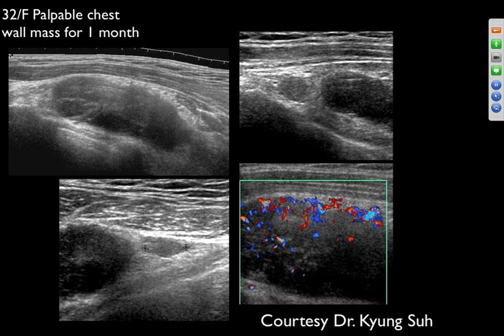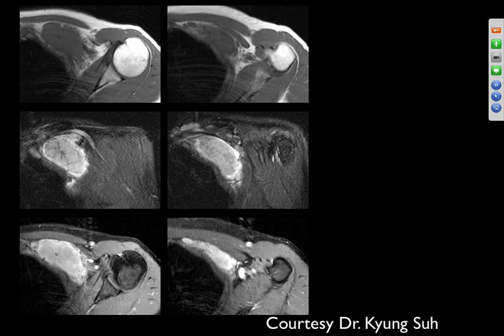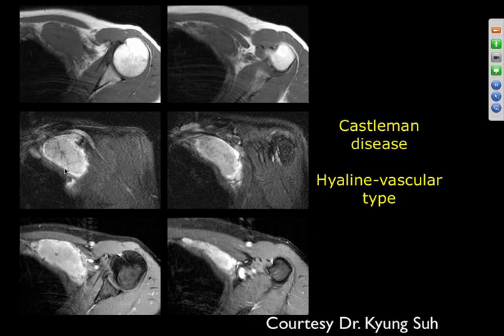Okay, Eric. 32-year-old female, chest wall mass, 1 month, showing hypoechoic appearance, but there is some color flow, and on MR also some mainly solid appearance with some pretty high signal, not as high as the myxoma we saw. So this could also be a liposarcoma. Yeah, and it has internal structure very clearly demarcated here.